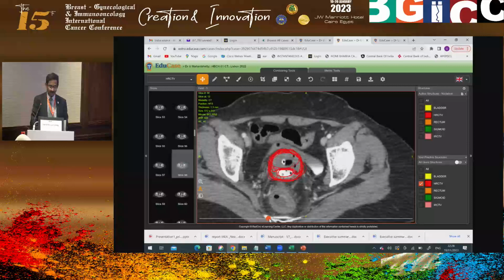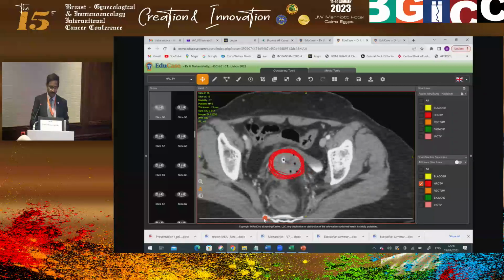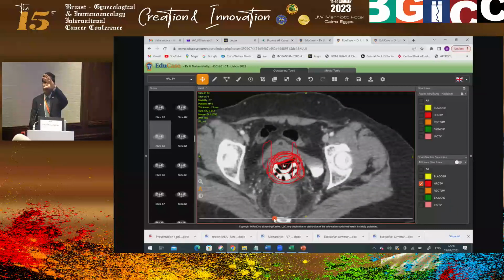The second mistake everybody does is including part of the applicator into the target volume, which is not recommended. You can include the tandem, because you see tandem is very, very small volume here. But at the vaginal level, the volume becomes big. It almost becomes double. And the reason why we say that is, if you have included the ring or the ovoids and your volume is 60 cc, high risk CTV, and I have excluded for the same patient and my volume is 30 cc, and you report that patient outcome after 5 years, I report the same patient outcome after 5 years, you say, oh, large volume, I have controlled this disease.